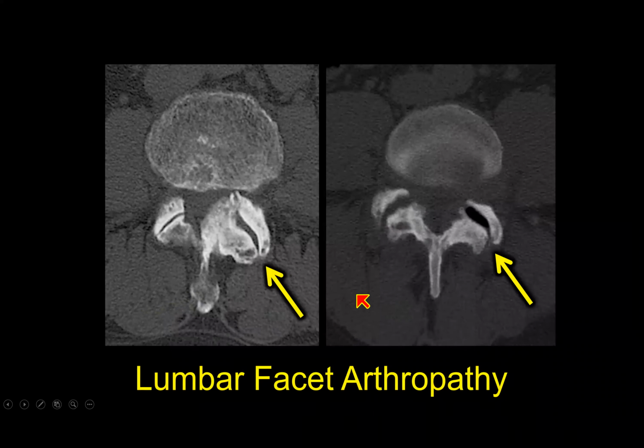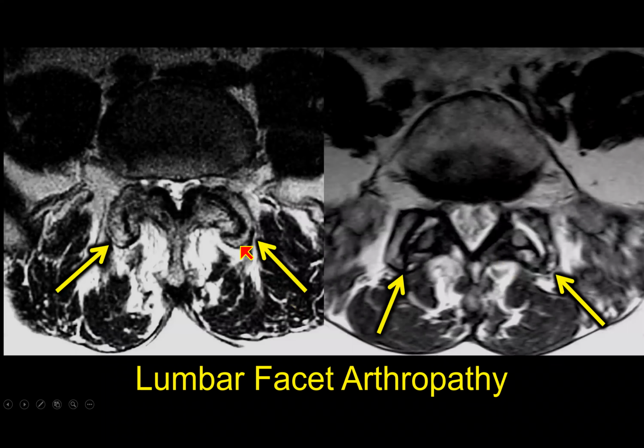Same thing in the lumbar level. So we have a lot of facet overgrowth, a big differentiation between this side and what looks more like a normal joint with the facets, whereas on this side we have all this overgrowth. And we might see fluid in there or air density. We sometimes talk about, is this a vacuum or nitrogen, but it's air density at that level on the CT. When we correlate that with the MR, we see all that osteophyte overgrowth around those facet joints.